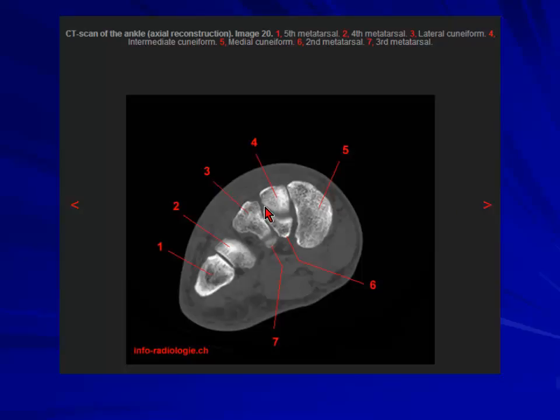So you need to tell them that this is the joint which is affected, even though you know that the second metatarsal is articulating with three bones. But you say this is the lateral side, this is the medial side, so the lateral part of the second metatarsal articulating with the lateral cuneiform is degenerative and has active osteoblastic activity, suggestive of the focus of the points of pain. So they can either go in and inject at this point, or they can fuse this if it is continuous and doesn't resolve with injection.